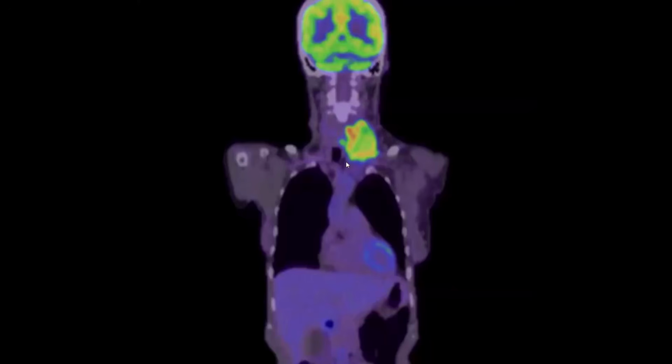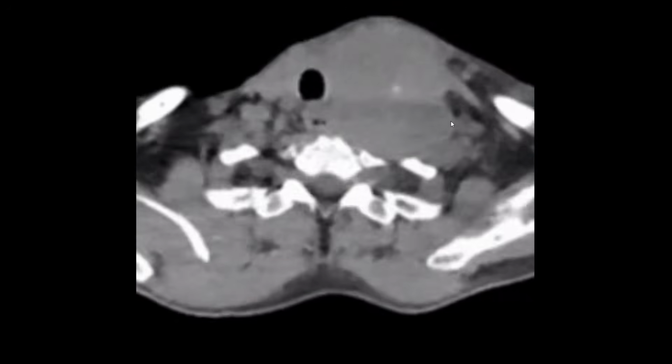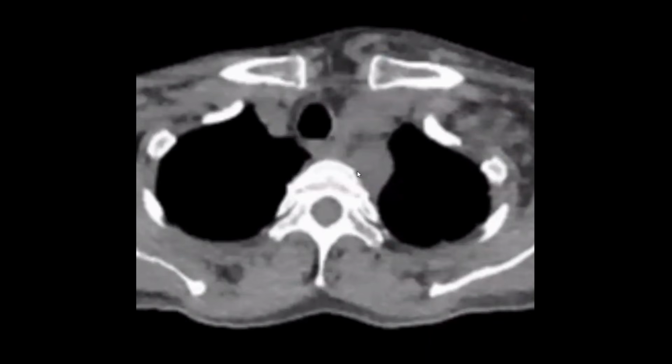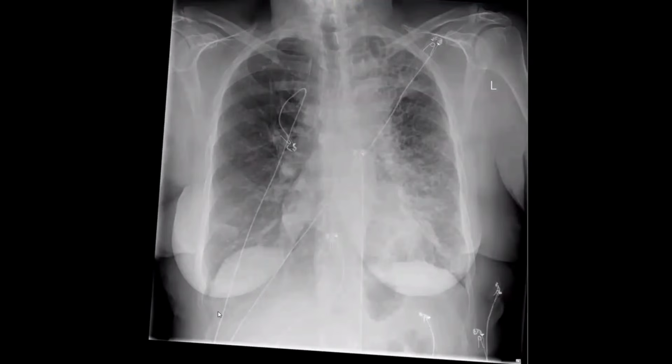They did PET CT for the case and the supraclavicular mass. Look at this one to help you. This is a thyroid gland. It's a very invasive thyroid gland mass invading the superior mediastinum. Okay. Let's go to the next case. Can you go to the next candidate?